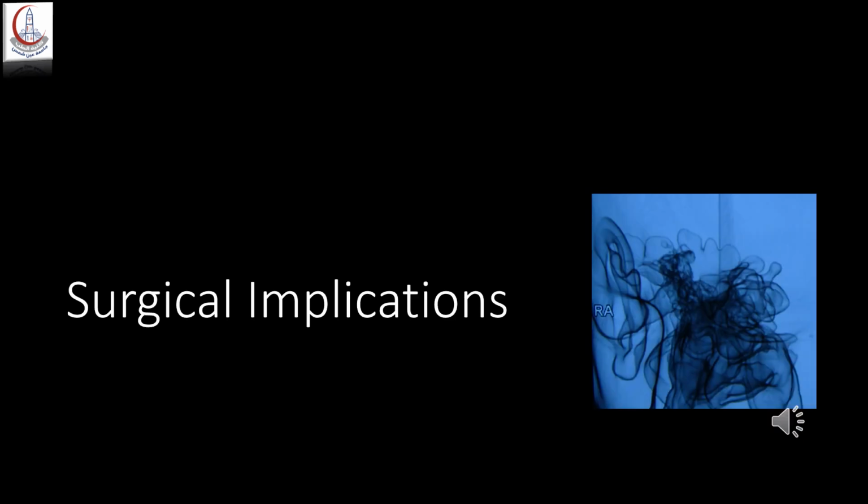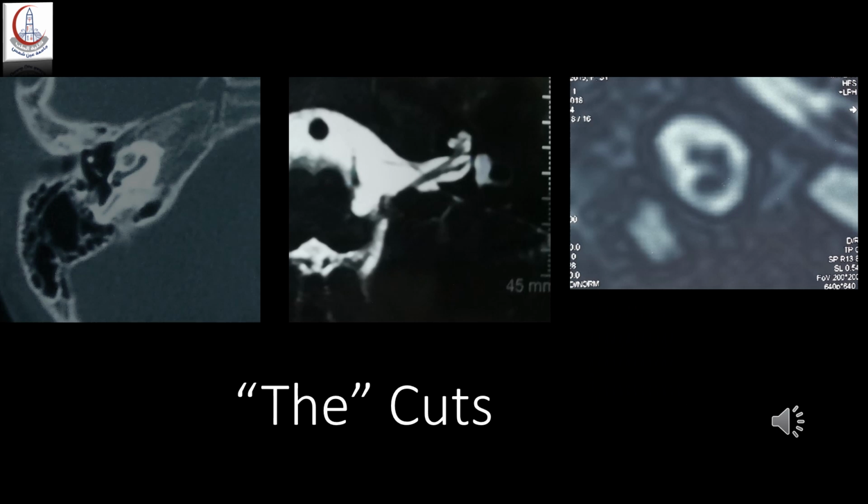We have gone through the imaging of the patient in a surgical strategy, and we are going to see what this means in surgical terms. Surgically, when you are planning surgery, you want to have a rapid view of what you are expecting. So what I usually do is look at these 3 cuts, and they give me a broad idea about what is happening for each patient.